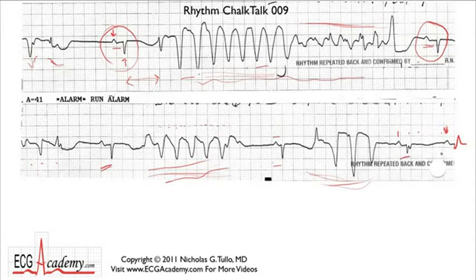Anyway, we've got a sinus bradycardia, or barely a sinus rhythm, but then we have these wide complex tachycardias. So when we're figuring out where a wide complex tachycardia comes from, what should we be looking for? Well, how does it start? Is there a P wave in front of the first beat? Because that's a really important clue. If you see a P wave with a normal or a slightly prolonged PR interval, then it's most likely atrial, and you start to think about Cardizem for some kind of atrial arrhythmia with aberrant conduction.